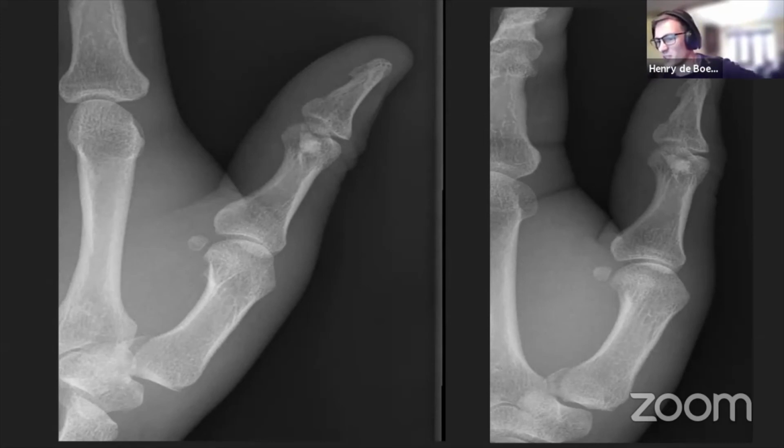Yeah, the cortical thickness was average, I think, in the previous film, Grace. Yeah, for all of these films, they're almost all films that I've reported in the last couple of months in Sheffield, but I've tried to pick ones that are otherwise normal apart from the injuries.